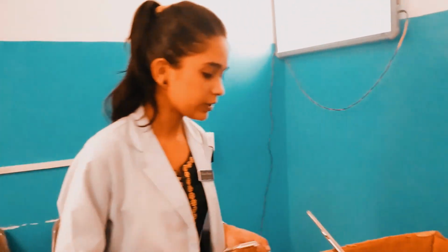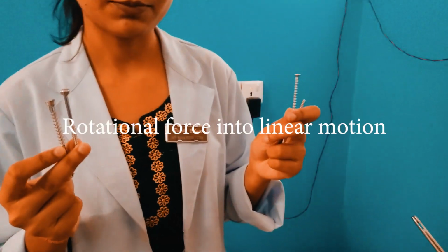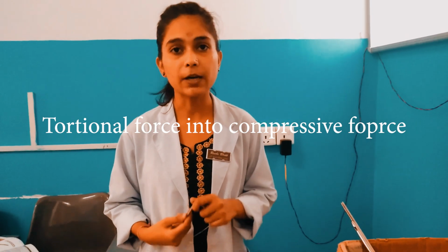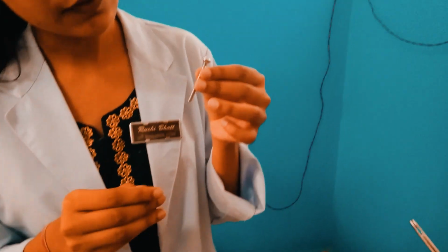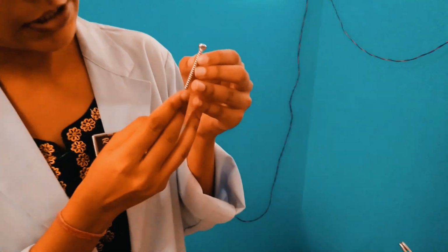Now let's come to the screws. So what is a screw? A screw is a mechanical device that converts our rotational force into linear motion, or we can say it converts our torsional force into compression force. Before talking about its function, we should know the components of the screw. This is our screw, and the components are the head, the thread, and the tip.